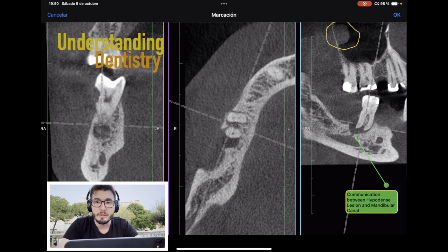If this was completely in continuation with the sinus floor, then obviously you would describe it as sinus membrane thickening. But now it's in the posterior wall, very well limited, homogeneous, with the shape of a pedunculated lesion, and that's exactly the shape of a sinus polyp. So that's the first alteration that we are seeing here.